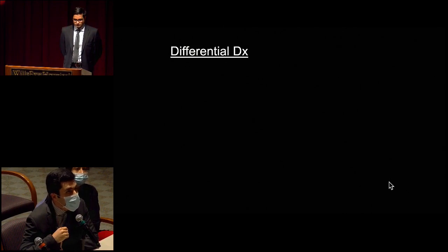So based on the information that you have at this point, what kinds of things would you be thinking about for this patient? Yeah, so we have a young patient with evidence of bilateral serous detachments and choroidopathy. I would be thinking of pachychoroid disease, central serous retinopathy, an aggressive form of central serous at this point. Maybe a case that I might look into even endogenous steroids if other differentials were not the case.